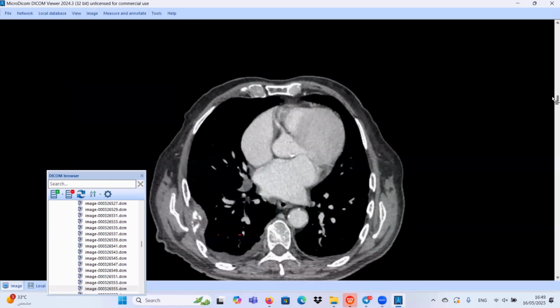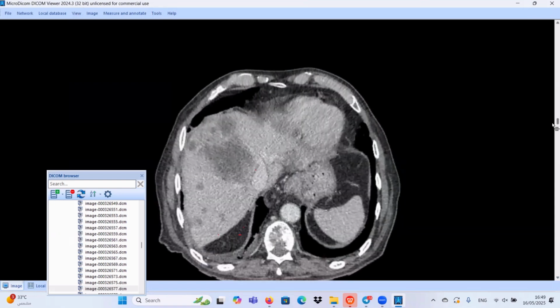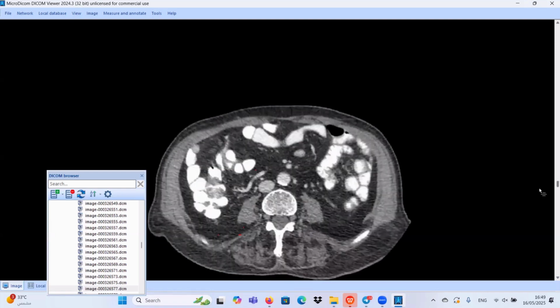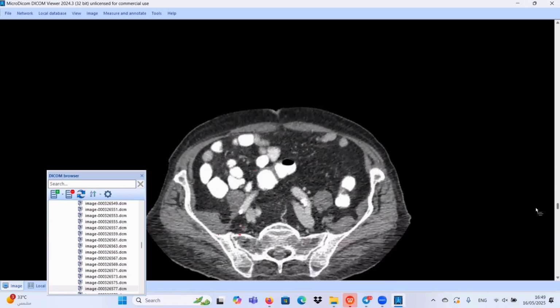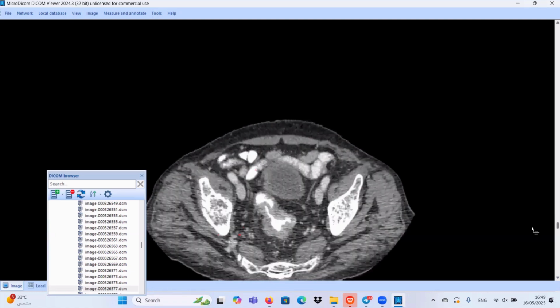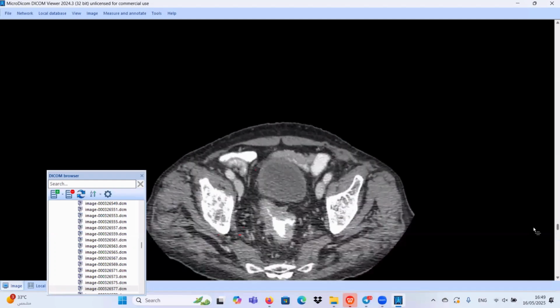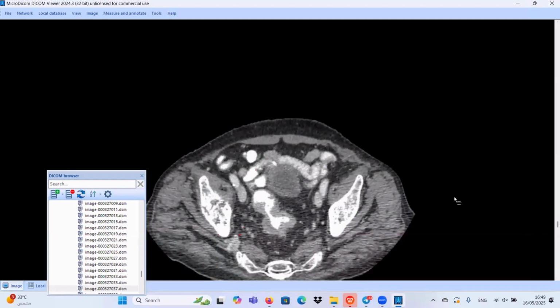I could appreciate bony mets involving the ribs with destruction and a soft tissue component. Yes, you are right at this area. Agree. Bilateral pleural effusion, multiple liver lesions in both the lobes. I could appreciate bilateral renal cysts. There is contrast-opacified large bowel loop. Okay. And there's eccentric thickening involving the rectosigmoid junction. Agree.